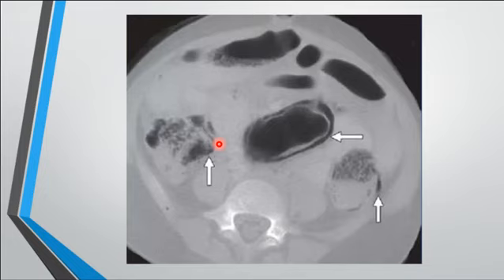So you should always, especially when there is some clinical suspicion, make a lung window to see the exact distribution of the gas within the bowel. Is it in the lumen? Is it in the wall? Is it extraluminal? It will make a big difference.